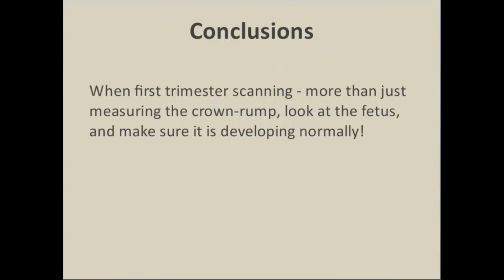So I hope you'll remember the fetus when you do your first trimester scanning. It's more than just measuring the crown rump. Do look at the fetus and make sure it's developing normally.